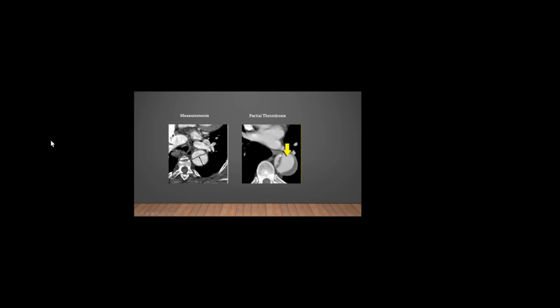So it is important across the time to keep an eye on what is the diameter of the false lumen, the diameter of the entire aortic sac, and the ratio between the false and the true lumen. And also to keep an eye on whether there is any new thrombosis developing in the false lumen. Sometimes it increases the endotension. Sometimes if the thrombosis increases in the false lumen, that would increase the pressure on the true lumen, so it might cause narrowing of the true lumen. So CT during the follow-ups, again, could provide a clear and solid report.